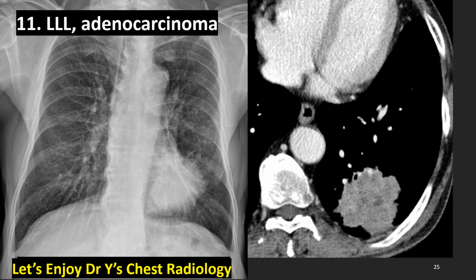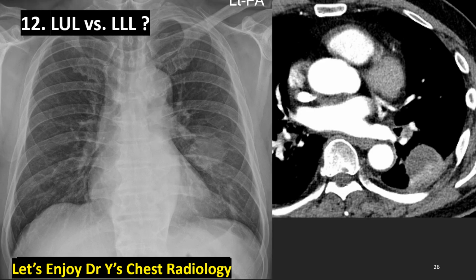A 6 cm adenocarcinoma in the left lower lobe, T3 staging, not in contact with the heart, just behind the heart in the left lower lobe location.